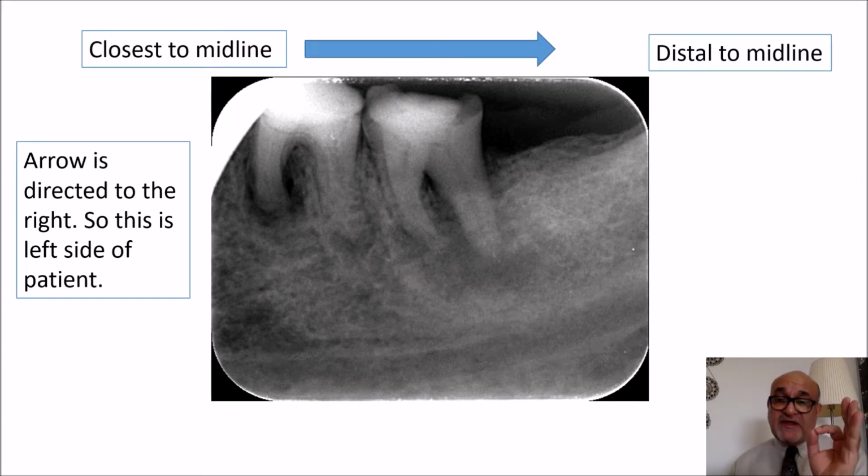From the first look at the radiograph, you should decide whether this is for the maxilla or the mandible from the anatomical landmarks, teeth basically, and the anatomical landmarks which are present. If you look at this radiograph, we can see the inferior dental canal over here. This is one. You will see the trabecules.